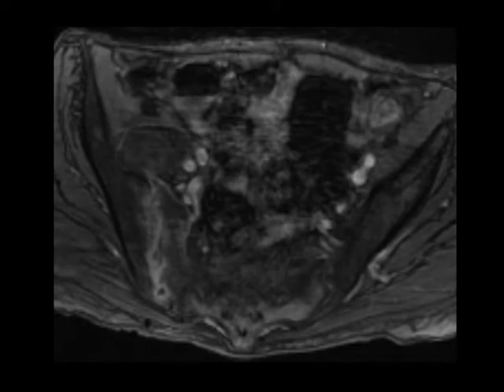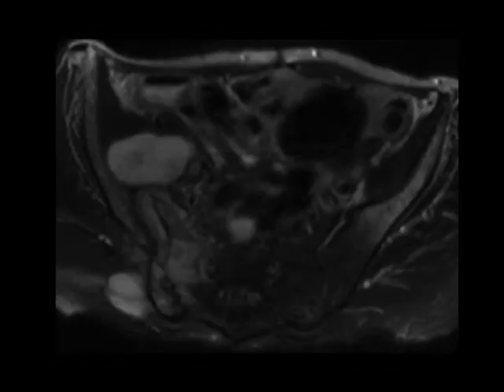Now, as you can see on these images, there's marked bone marrow edema throughout the right hemipelvis, particularly on both sides of the sacroiliac joint. T2 bright, T1 hypointense, and you can see that there's abnormal enhancement associated with the right sacroiliac joint. Just as concerning, on both the CT and T2 weighted images, you can see that there's actually a fluid collection directly extending outwards from the right sacroiliac joint anteriorly.